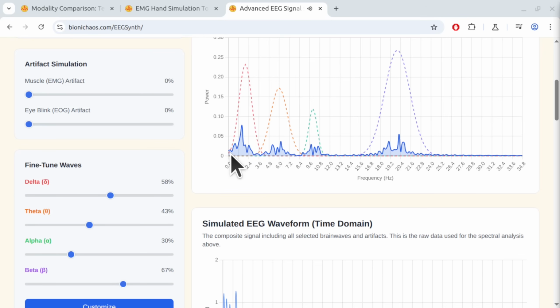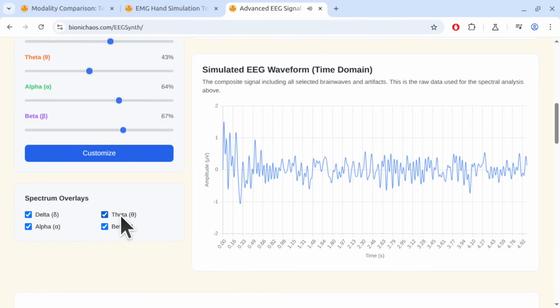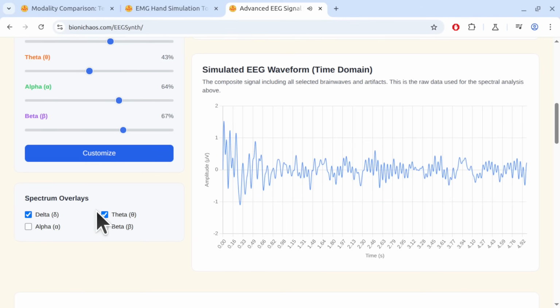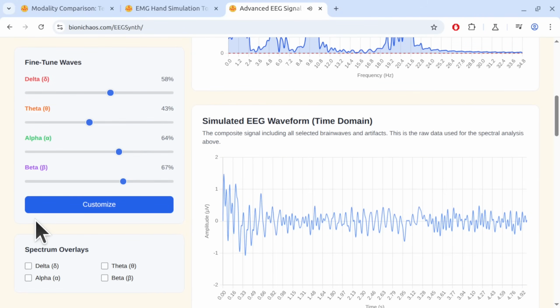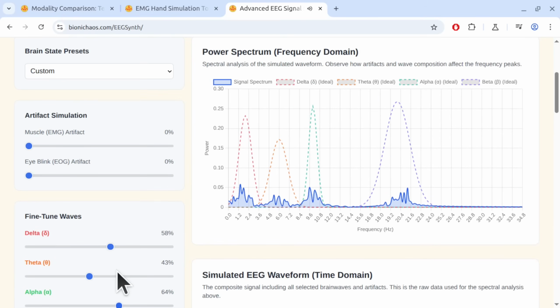Lots of possibilities. So ultimately, this simulator, as the source presents it, is a dynamic learning tool for newcomers, right? But also a practical utility for people already in the field. Exactly. It makes the complexities of EEG, which can seem pretty daunting, much more intuitive and interactive. It helps bridge that gap between the raw squiggly lines you record and the frequency information hidden inside them. By letting you build it up yourself and see the connections. Precisely. It demystifies that relationship.